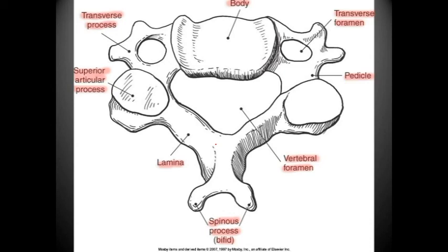So that brings us to a traditional vertebral layout for cervical vertebrae and pretty much for the rest of the body, with certain exceptions like the transverse foramen. So we do have the superior articular processes here.